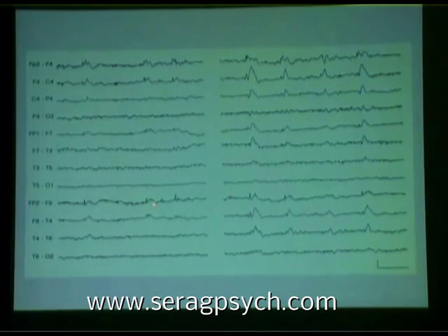These look just like artifact. Exactly. You couldn't call that, for example, a spike. That you'd even have difficulty calling. Maybe that. This is easy here, you see. So don't make up your mind too rapidly about whether sharp frontal polar things are eye movements or whether they are spike discharges. Next, please.